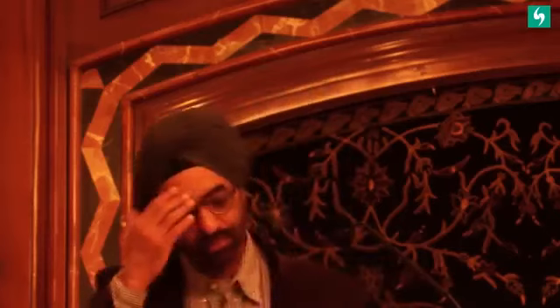Dr. Tulsi talked about the significance of Q waves and what the depth of the Q wave should be as compared to the R wave. I would like to draw everybody's attention to what we call a tall T wave. Now, what is a tall T wave by definition? And in how many leads should we have a tall T wave? A tall T wave in a single lead, would it be significant? Generally, you won't get a tall T wave in one lead.